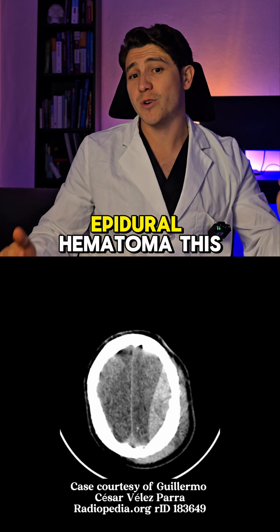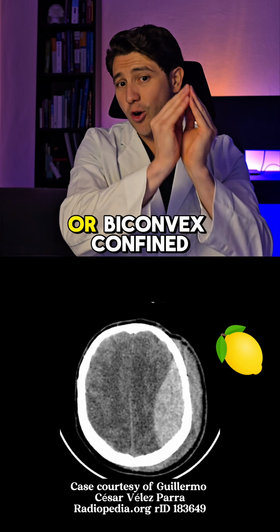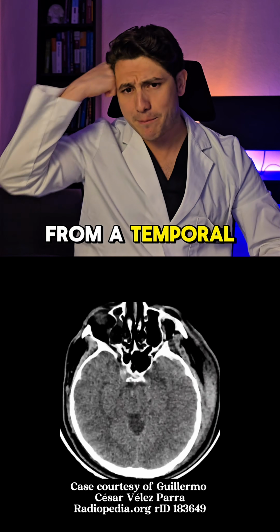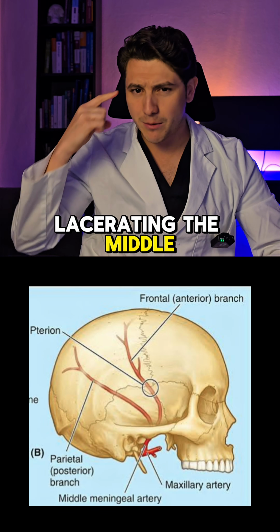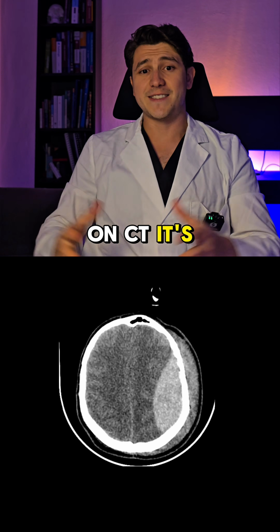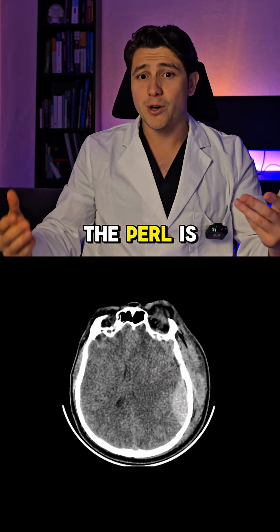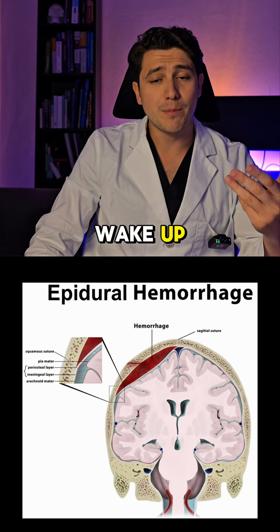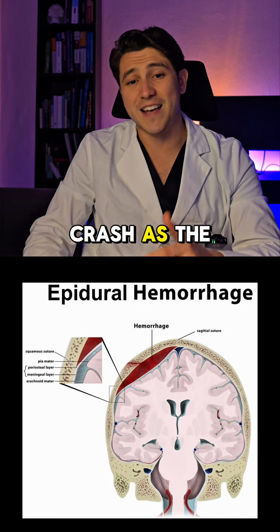Third is an epidural hematoma. This is lens shaped or biconvex. It's confined by the sutures. It classically results from a temporal bone fracture lacerating the middle meningeal artery. On CT, it's a bright extra-axial mass. The pearl is that about half of the patients have a lucid interval, so they wake up, they seem fine, and then they crash as the hematoma expands.